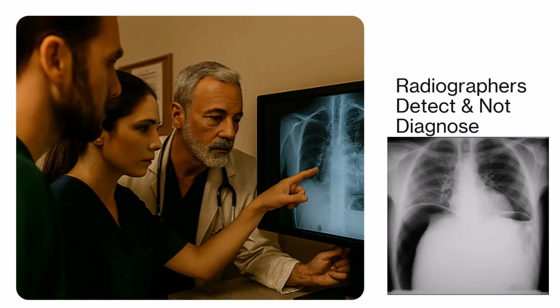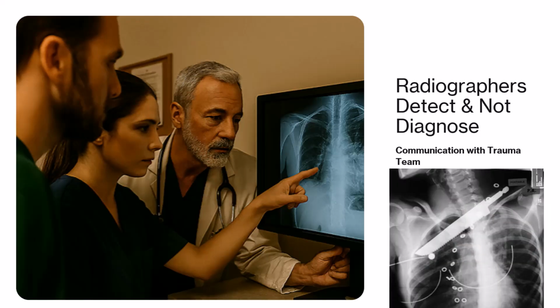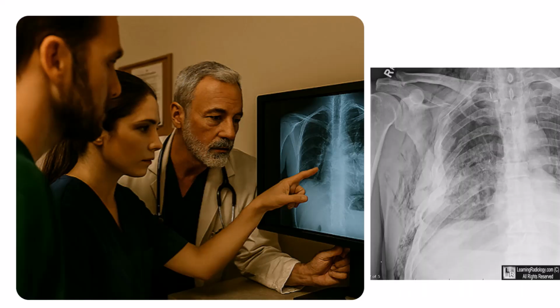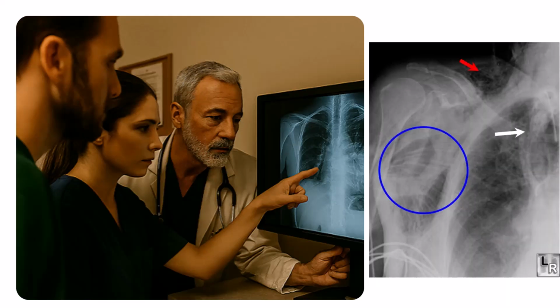We need to be able to visualize free air under the diaphragm because that suggests perforation, and find foreign bodies that are ingested or impaled. A widened mediastinum shows us that there is a possible aortic injury, and a flail chest or multiple rib fractures are very dangerous. When you get impacted tissues, it can drive air into the tissue of the muscle around the chest, and you can see subcutaneous emphysema also.